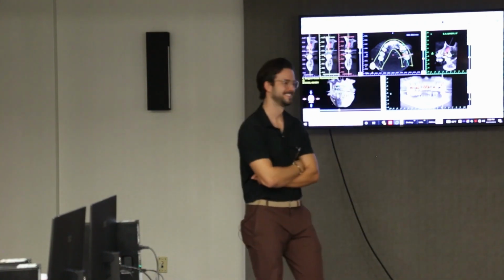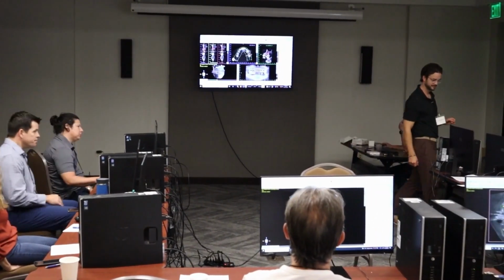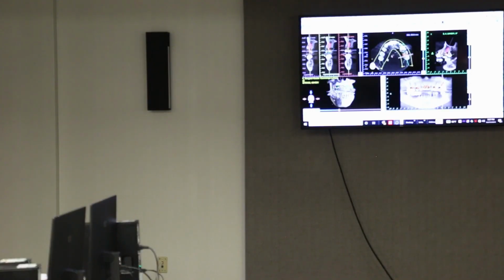So let's jump into some cases. Everyone should have the toys case up there. I'd love that everyone just watch a few things. There's a few things that are really critical. Fortunately, I've got a pretty small projector up here to have all 5 windows.